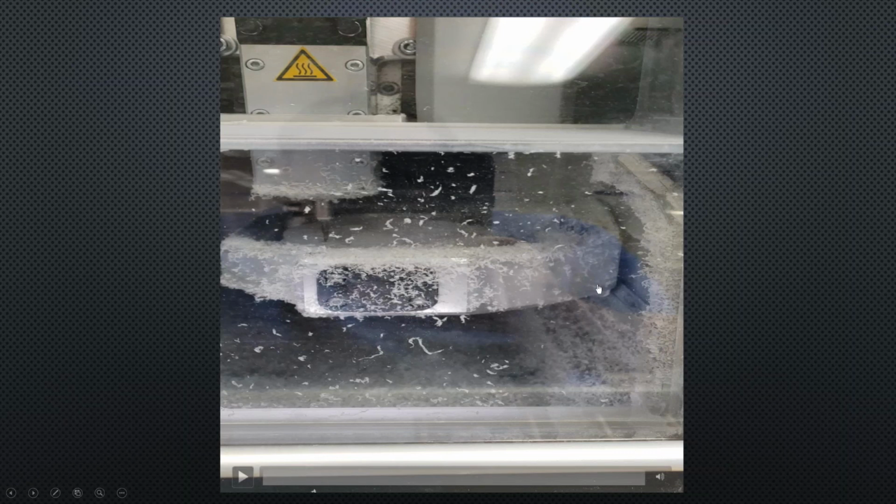And the only thing that I have found you've got to be careful of, and you'll see it again in this video, but I want to talk it through before I show you the video, is over here is where it docks my tools or my burrs from my machine, and it's a rubber grommet, and I've never had an issue. It gets really built up with chunky stuff. I've never really had an issue with it positioning a burr wrong or jamming in any material. It blows and cleans that area off before it places, and it cleans it pretty good.